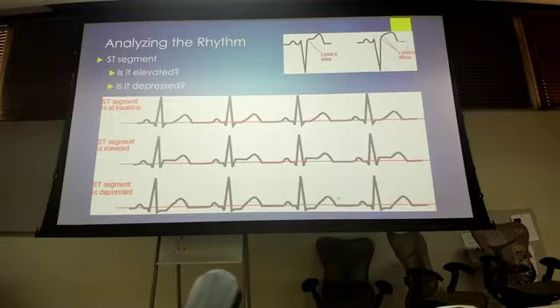So if I say, oh, lead 2 looks great, well, good. I'm happy that lead 2 looks great, but that's giving me one little part of the heart. I need to look at the rest of it. So now my eyes are going from that 10-second strip up to the main portion of the ECG. Prior to this, I haven't looked up there that much. I've been looking down here to give me the rest of my information. I'm now going up to the main portion of the ECG.